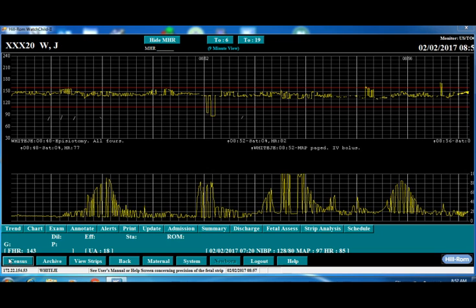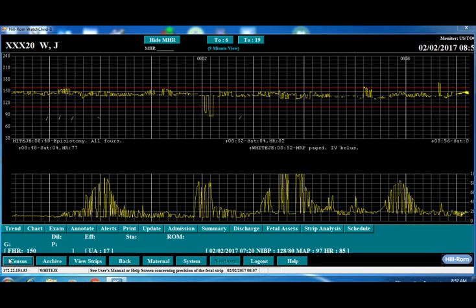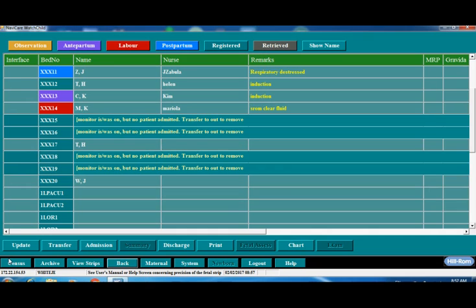You may access the census board by clicking on the census button in the lower left-hand corner of the surveillance screen. This populates the list of patients currently on the unit. The census board is a summary of the unit and may be used quickly to understand patient care. The nurse can change the status of the patient on the census board and add their name beside the patient at the beginning of their shift.